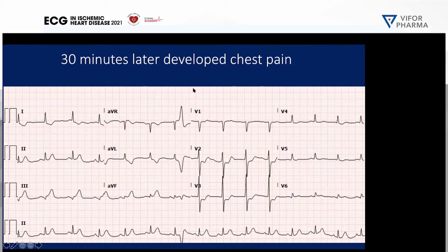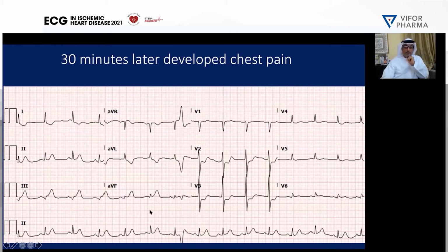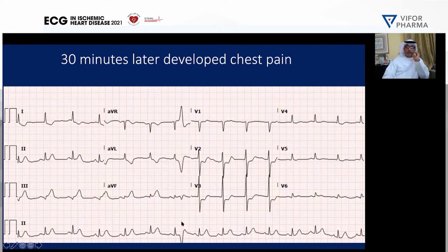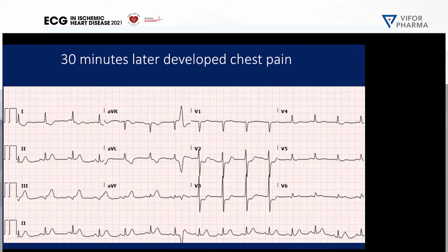You see? So that's his ECG 30 minutes later, Dr. Bakir. So completely different, yes? Yes. So can we interpret? Yeah. Rate, same, does not change. Interval, rate, rhythm, same. Axis is normal. There is one ectopic beat, a single ectopic, and the ectopic beat falls on the T wave. Very dangerous. Yes, very dangerous. Yes, a ventricular premature beat falling on the T wave, the very vulnerable period.